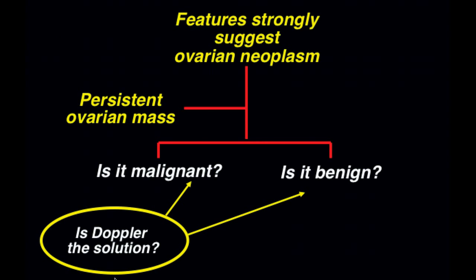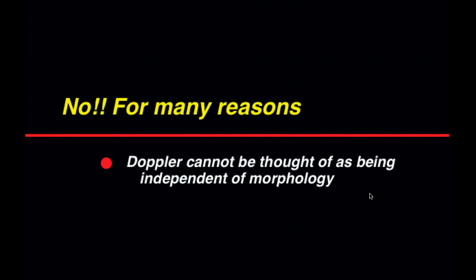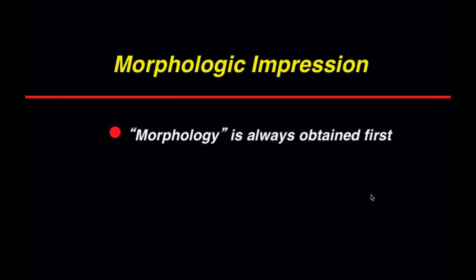So, is Doppler the solution to deciding whether lesions are benign or malignant? And the answer is no, for many reasons. But the most important is that Doppler cannot be thought of as being independent of morphology. Morphology is always obtained first.